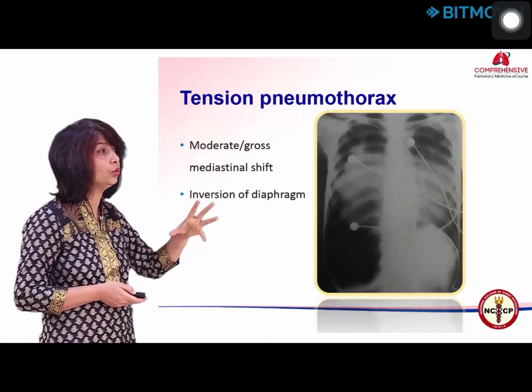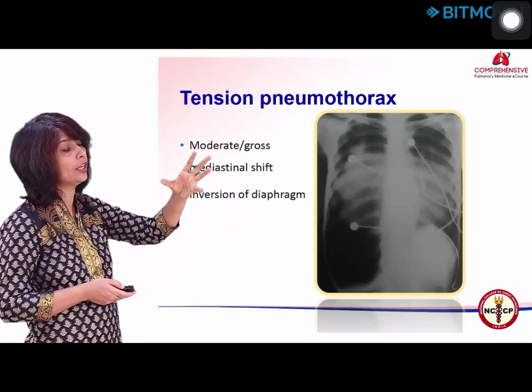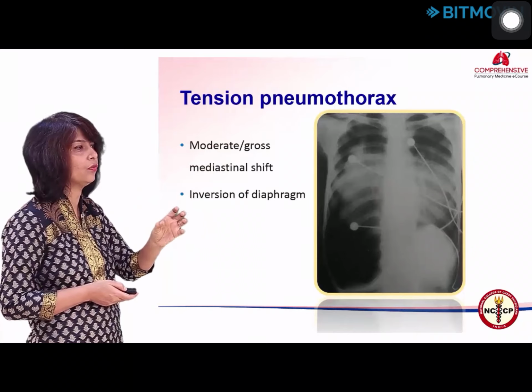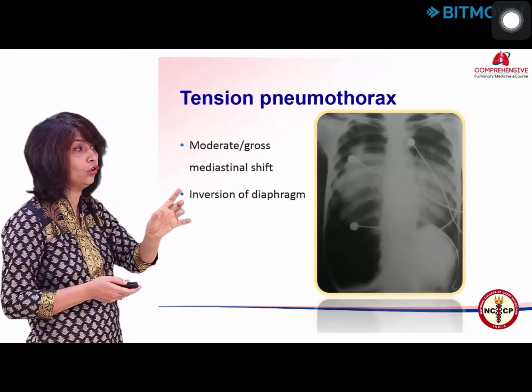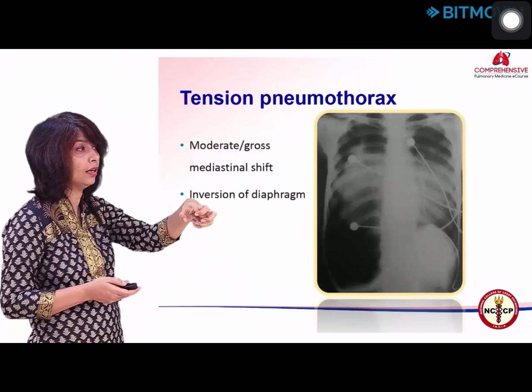For us it becomes a big challenge, even after this, in big masses, to tell whether it's inversion or whether it is a defect, because what does defect mean? That half is in the thorax, half in the abdomen. Inversion means all in the thorax. The surgeon wants to know which approach should I take. Should I go from above and pull it down, up?